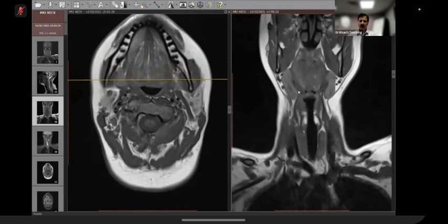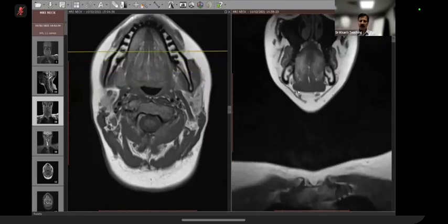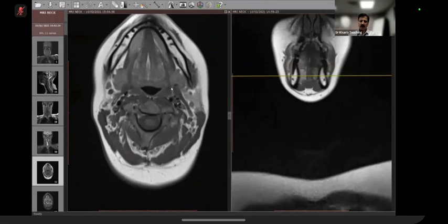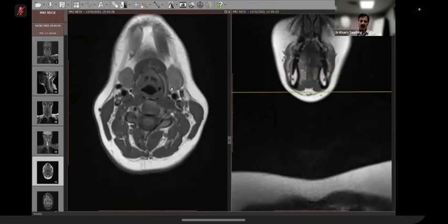On the other hand, from the hyoid will be the anterior belly of the digastric, which ultimately is here. You see this thing? This is the anterior belly of the digastric. We covered it when we did oral cavity.